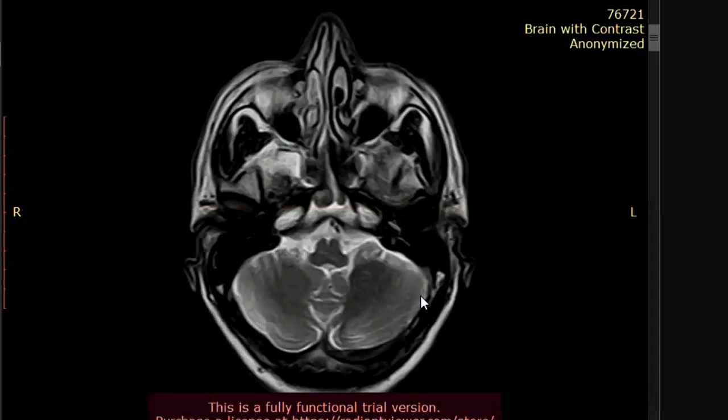The purpose of this case is that they always show you dural sinus thrombosis. Whenever you see any infarct or vasogenic edema, it's not always a typical case of bilateral venous infarcts. At times they can show you a unilateral infarct. So always look for the dural sinuses, their hyperdensity on CT, and if you see definite high density, ask for MRI or MRV, and then the most diagnostic is CTV.